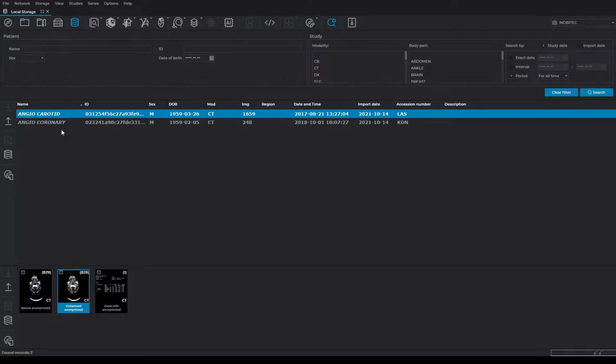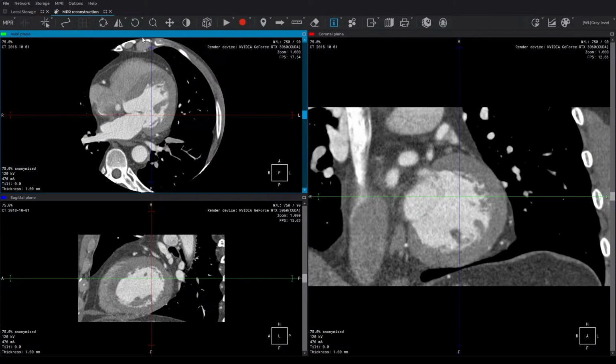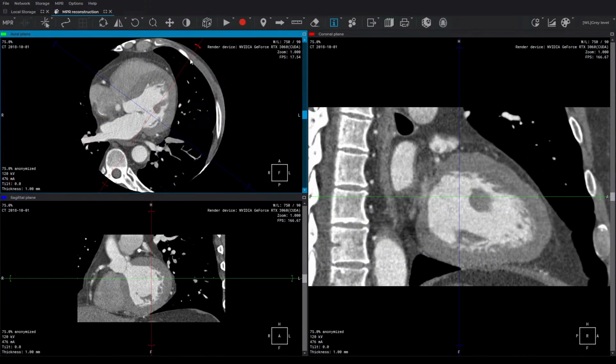So we're going to show you our newborn feature, which will be released in version 2.6, called segmentation by contouring, the contouring tool. And I guess it will be very helpful for those professionals.